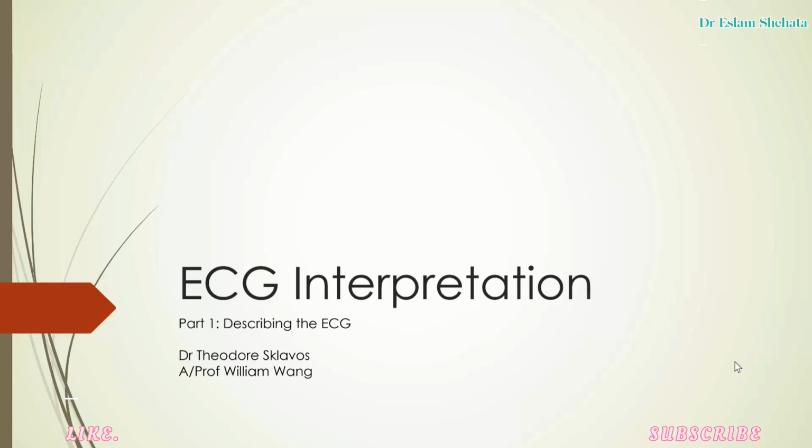My main aim in this series is to help you feel confident in your ability to interpret the ECG, and to go on to practice safely as a doctor. I also want ECGs to make sense to you. Rather than memorizing a list of rules, I want you to understand what you're seeing. If I can convey that to you, I'm sure you'll be able to practice more confidently and safely as you move through your medical training.